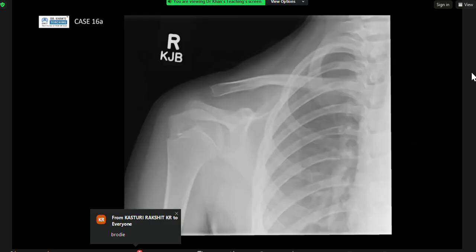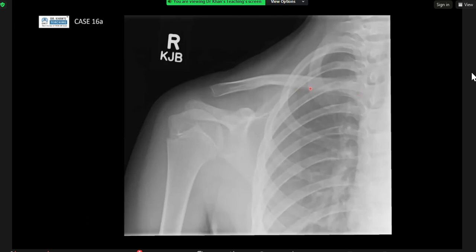Yeah, well done. So going back to the first one, you can see that there's actually expansion of the medial clavicle. You're right. There is no significant bony destruction, but what you have here is periosteal reaction along the medial edge, just underneath here, and possibly along the top. This is smooth periosteal reaction, suggesting this is a fairly chronic process.